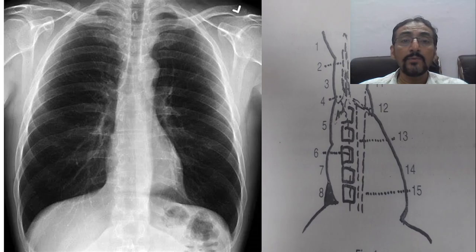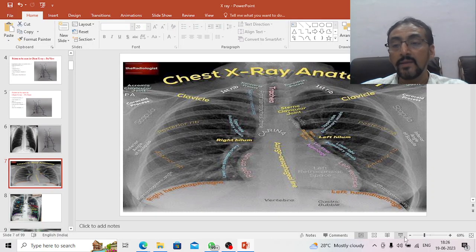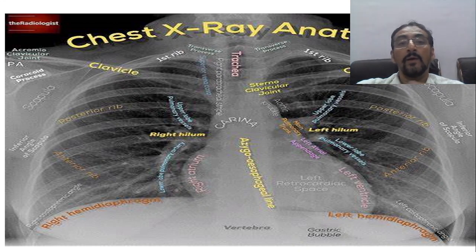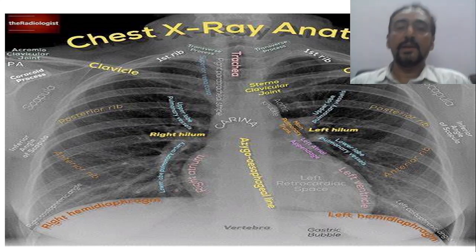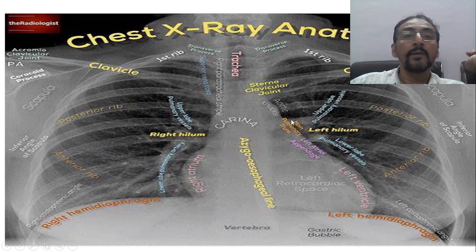So now you just look at this particular x-ray. Okay, now the same x-ray हमने थोड़ा उसको और अच्छे से बना दिया, so that it is very clearly visible for you all. Okay, now the same, see the trachea is coming over in the midline जो अब तक हमने देखा. See what is this?